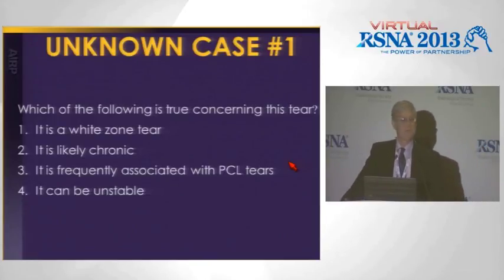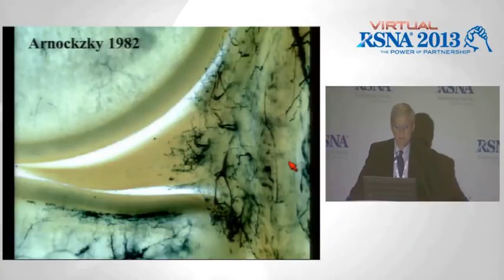Is it frequently associated with PCL tears? Well, we know that's not true. It's with ACL tears. And over time, they can become unstable. So that's why the surgeon wants to address them at the time they're also addressing the ACL tear.